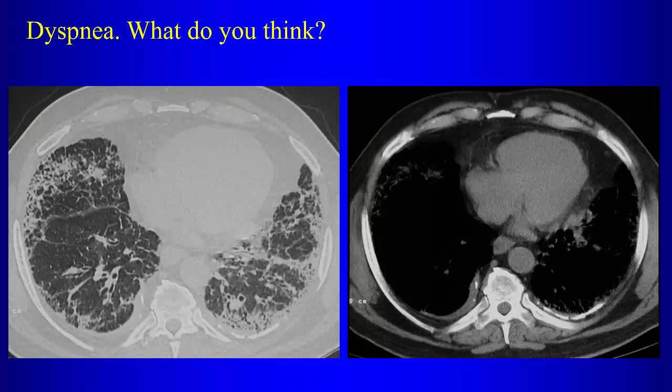All right, so this patient has had asbestos exposure. We can tell from the pleural plaques and the pleural thickening, right? So then the fibrotic interstitial lung disease here, even though it is a UIP pattern, is going to be asbestosis, which is fibrotic lung disease secondary to exposure to asbestos. So that should be your top choice here, not an idiopathic interstitial pneumonia.